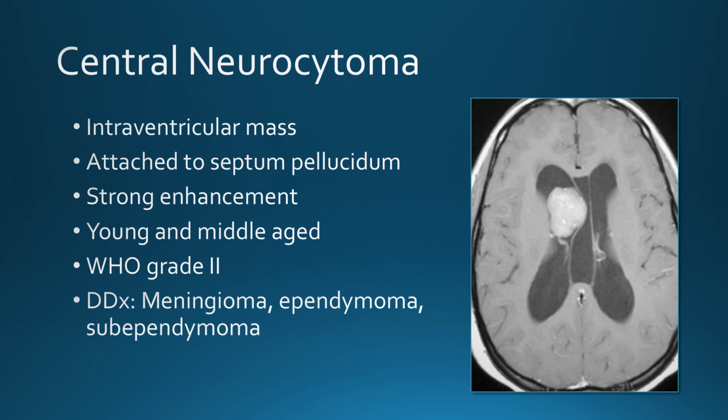And the differential is typically meningioma, ependymoma, or subependymoma. Subependymoma does not enhance with contrast. That's how we differentiate it from a central neurocytoma.